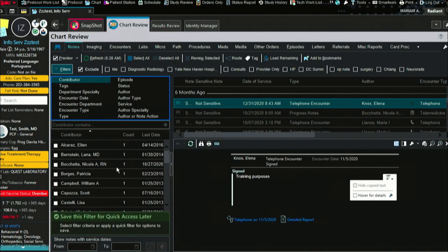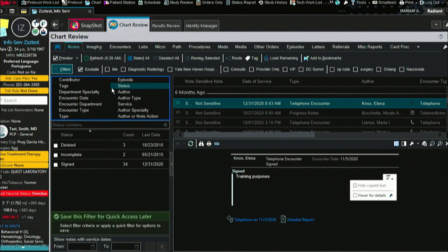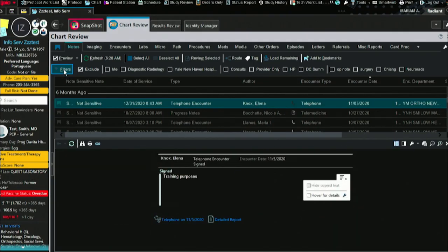And in the search feature, you can identify information based on encounter date, or based on status of the order, or the service that ordered the exam. So if somebody has a headache and you're trying to image their MRI brain for the headache, you want to know, did the patient come in with facial droop? Did the patient come in, was this headache instant, or was this headache happening for a couple of months? You can get all of this information from the electronic medical record through doing these search analyses.